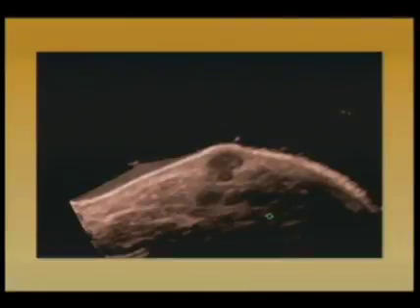Now I should also point out that the skin image that's shown here is not completely faithful to the original lesion, and that's because of the way this image was acquired. It was not acquired with a dedicated 3D ultrasound transducer. For this, I used a standard linear array, which I moved manually through space, and that has some artifacts associated with it. But the point is that you can get very high resolution three-dimensional images this way.